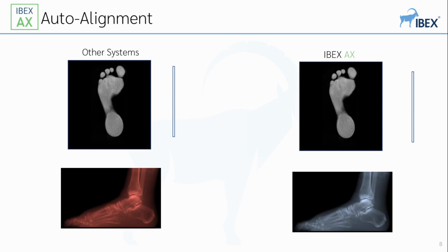This produces the 2D images at the bottom of the screen. As you can see, both of these images are an accurate lateral view of the foot.